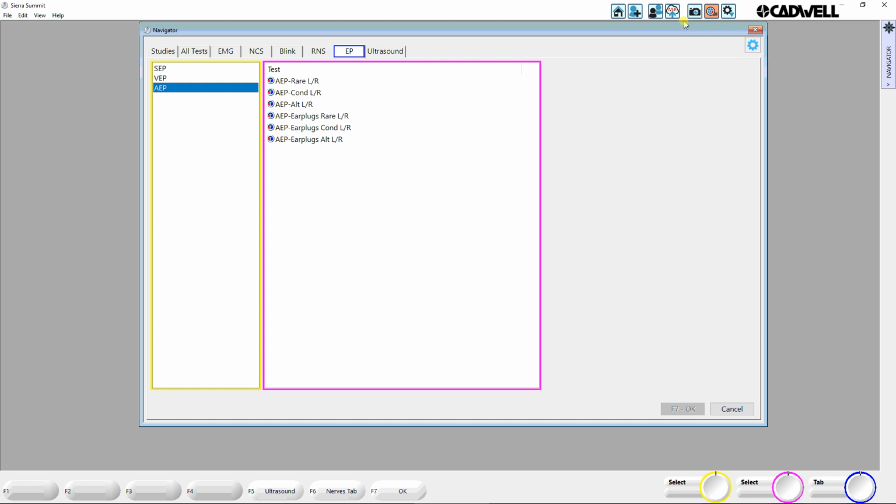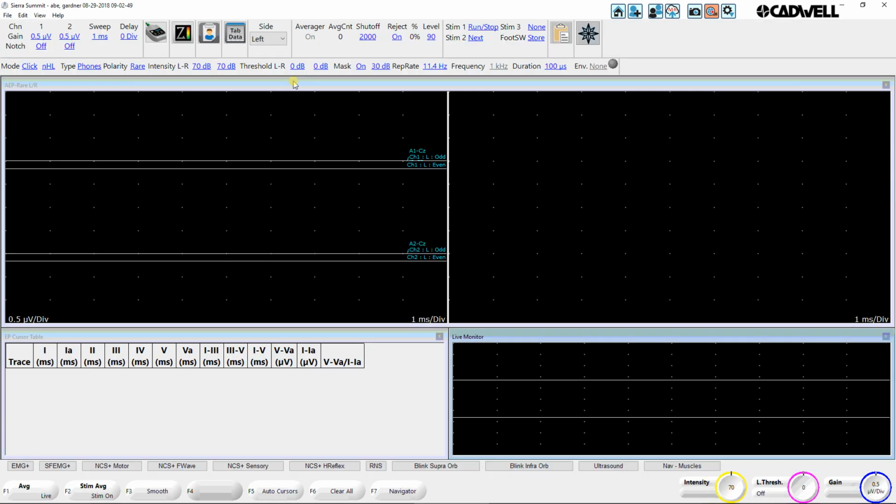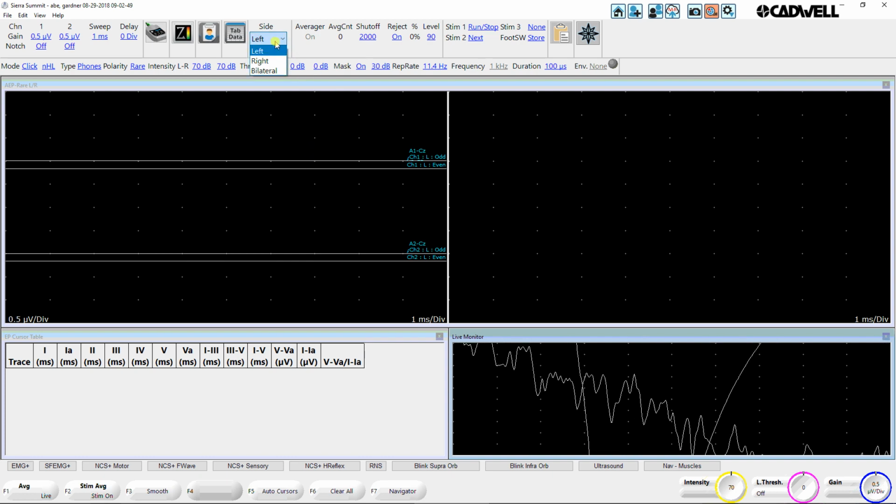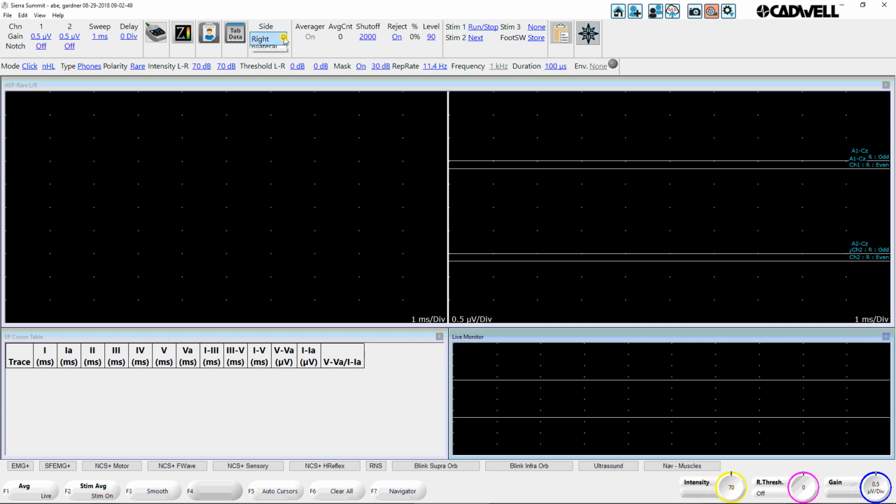This video will cover the basics of running an AEP test on the Sierra Summit version 3.1. When you open the navigator, go to the EP tab or All Test tab, select AEP, and double click on the test that you want to run. This is set up as a bilateral test, so make sure you select the correct side that you're going to start with.